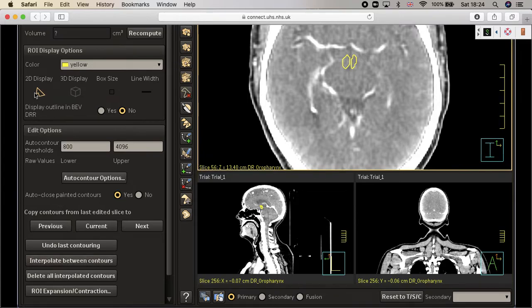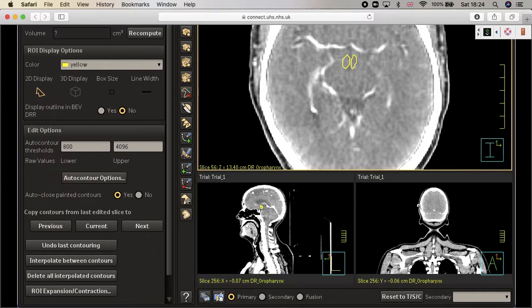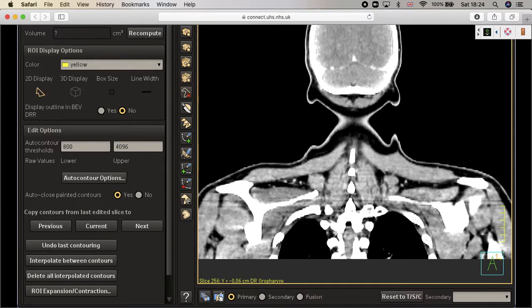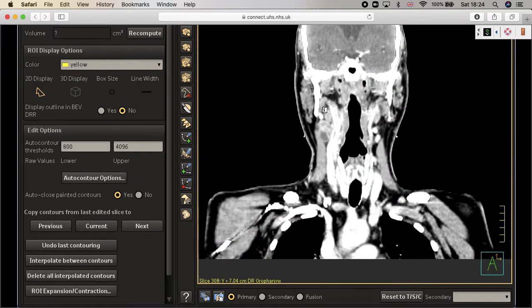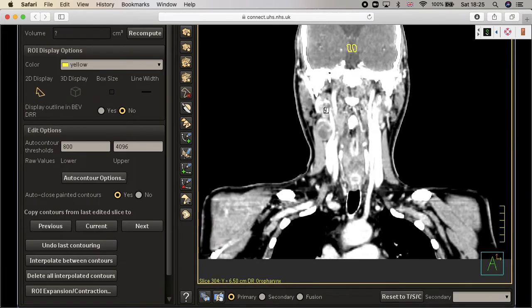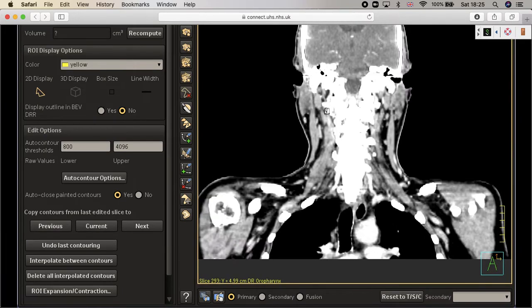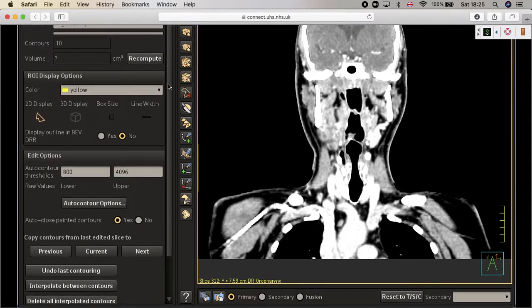Okay, good. So interpolate the structure. When you look at this coronal view, maximize it, you will end up with a structure as if it's two limbs situated on either side, exactly in the region where the hypothalamus should be. Let's look at it. This is the hypothalamus, and if you see these two limbs on either side, I would say this is the hypothalamus. Just by knowing anatomy, I can localize it. I'll show it to you in the MRI, and you may believe me.